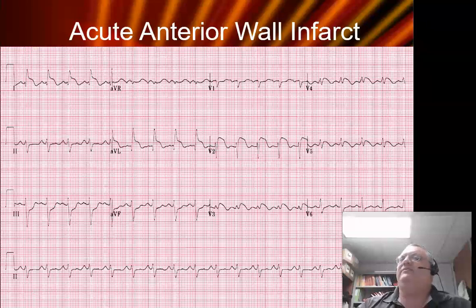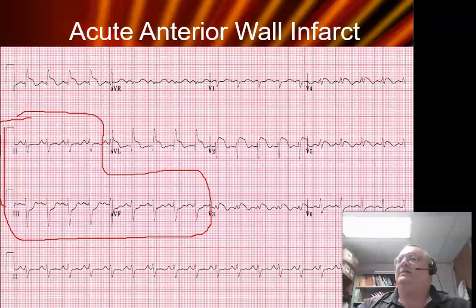Guys, I'm actually going to give you an overlay, and it's color coordinated. When we start looking at what is what, as far as where the damage might be going on with a STEMI, it is so very important that you understand that.